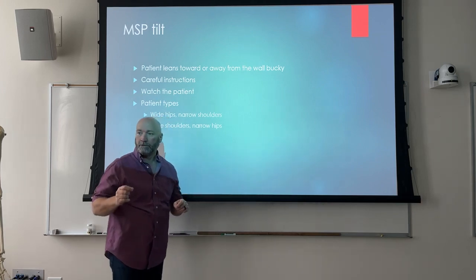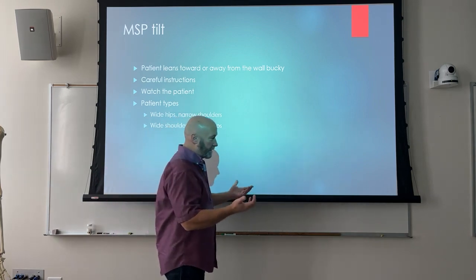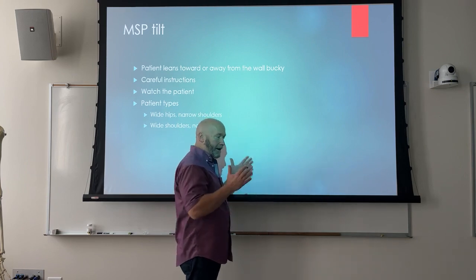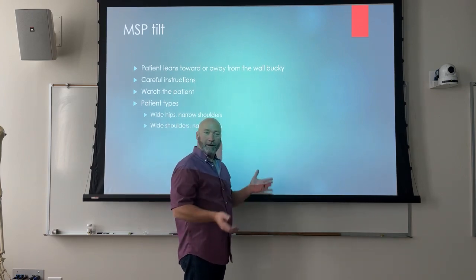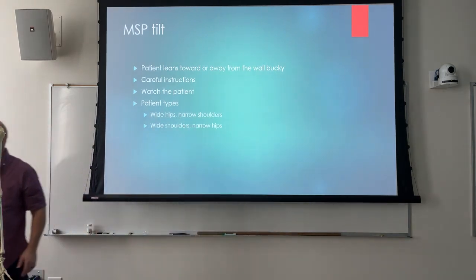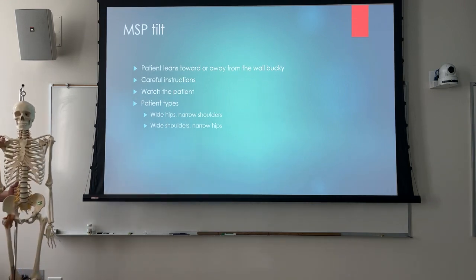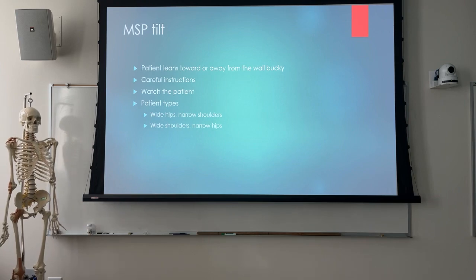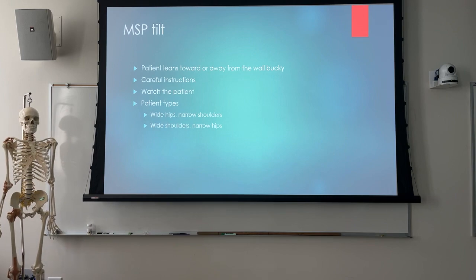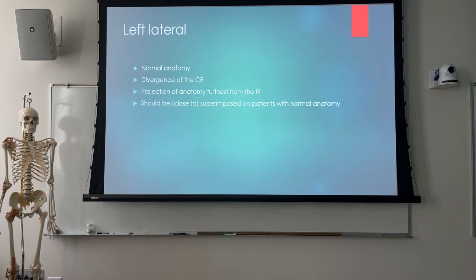Still, what you're going to do is look at the gastric bubble. So positioning-wise, just have the patient stand completely upright and not lean into it, and you can avoid most of that. But when you have a patient that leans into it, and sometimes your patients will position themselves after you get done with them, make sure you take a look at your patient before you press the exposure button and see what it's going to look like.